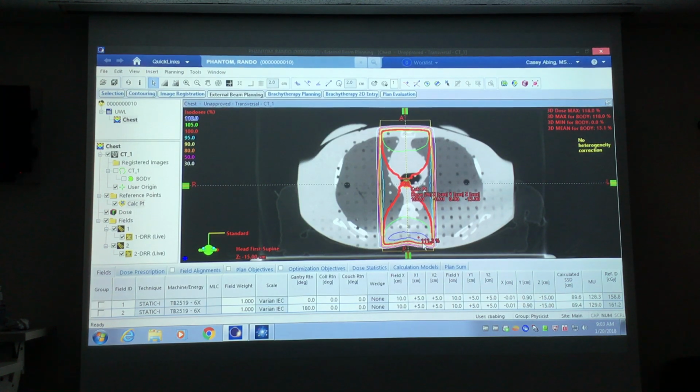Now I've recalculated, I still get the same hourglass shape. My dose distribution may have changed a little bit. You'll notice that my monitor units have changed. Okay, they've decreased because I've moved the point of normalization closer to the source of the machine. So now I'm at 100 centimeters SAD, so 100 centimeters to the source.